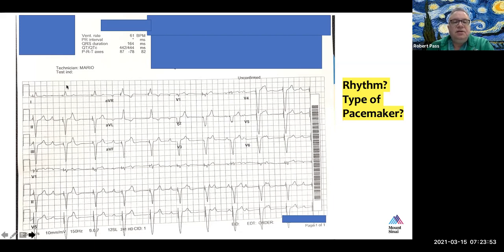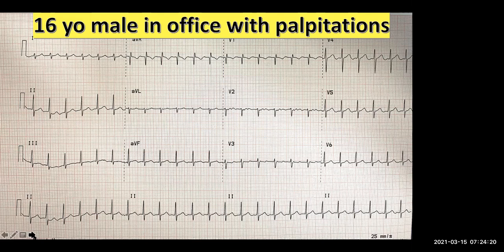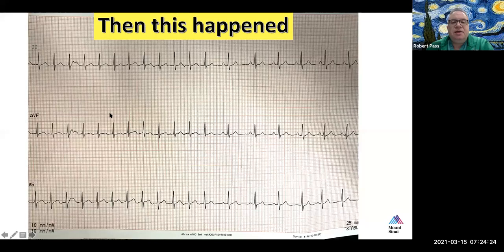Okay, let's move on to the next one. So this is a 16-year-old boy who has come into the office with palpitations. And why don't we go to Neha Luwalia. So Neha, this is the ECG. Patient is in some kind of tachycardia. Right. And I'm just going to show you what happened. This happened in the office.